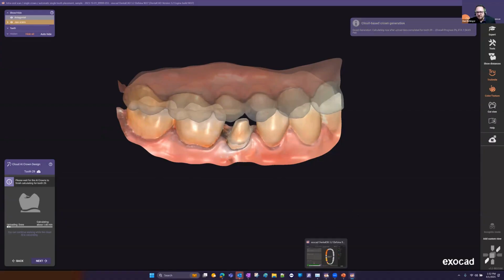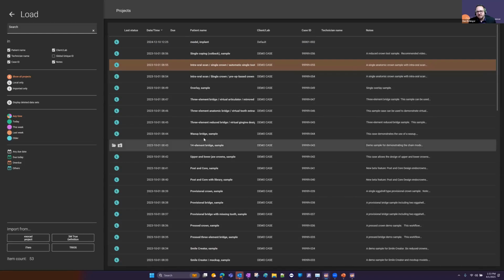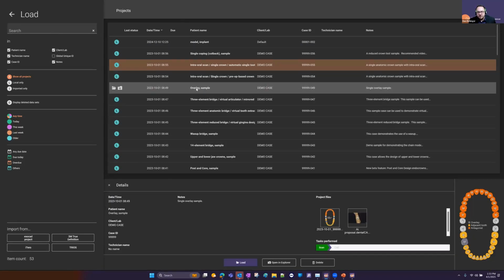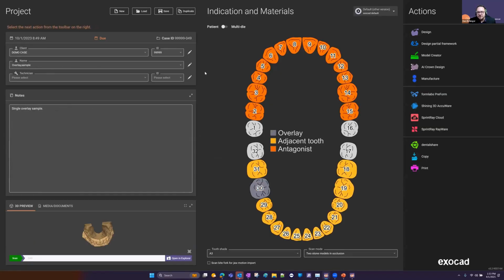But similar to what I was talking about earlier, we have a generation going, so going back to my DB now, I'm going to load my next case. When you're trying to make the most out of your productivity, let our software do the work for you and prepare your next case. Maybe you don't have it created yet, so you start your new order form and so forth.